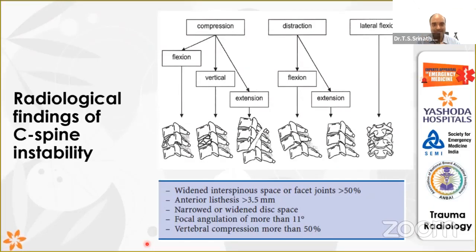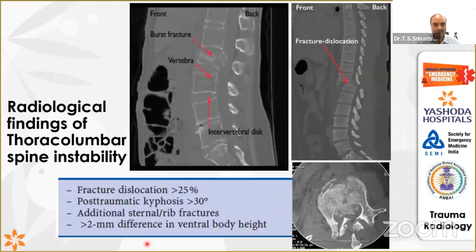So this again is important when you see your CT scan and decide where the fracture is, where the dislocation is, and then also trace the nerve involvement, looking for the motor as well as the sensory as per the dermatome it supplies. Then only you will be looking for fracture, dislocation, rotation, and then the neurological involvement.